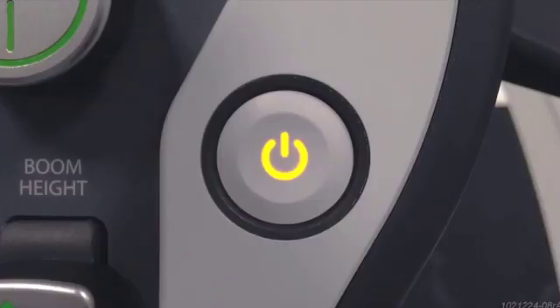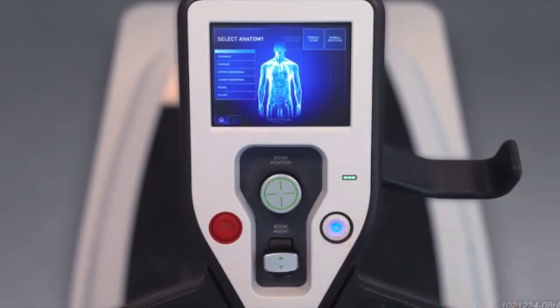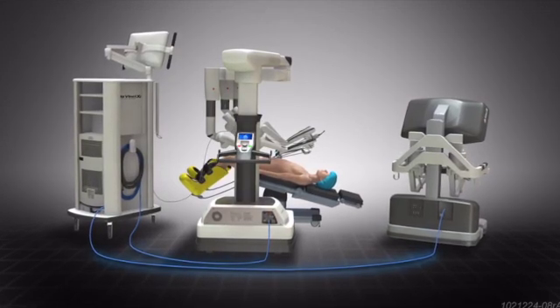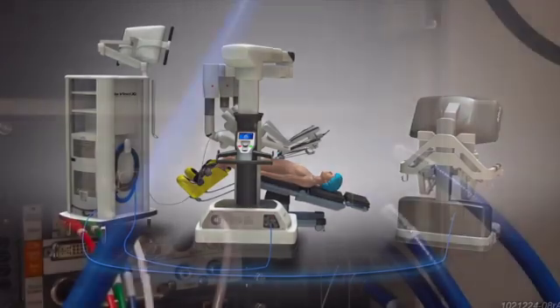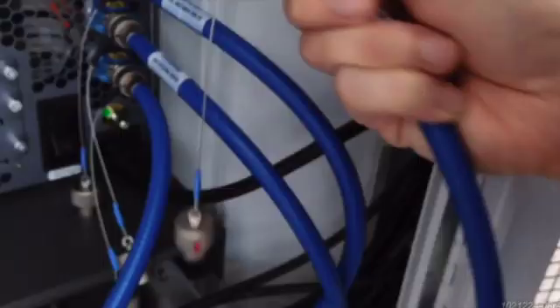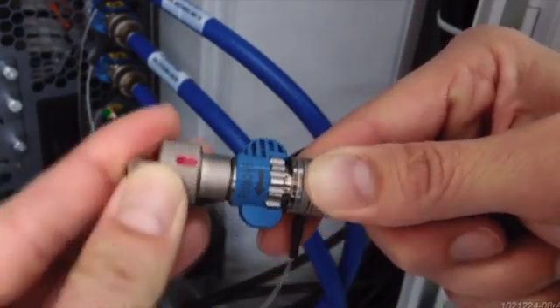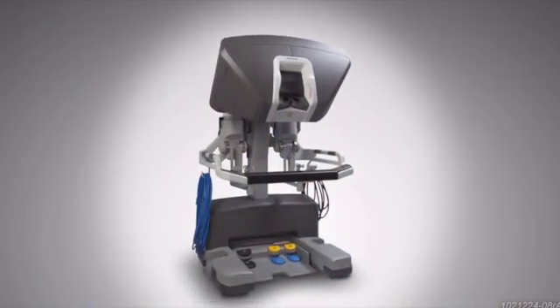During this 10-second process, non-sterile staff may cancel shutdown by pressing the power button again. Whenever possible, leave the system cables plugged in to minimize exposure to contaminants. If necessary, once shutdown is complete, non-sterile staff may disconnect system cables, place the protective cap on each cable end, and store cables on each component's cable hook.